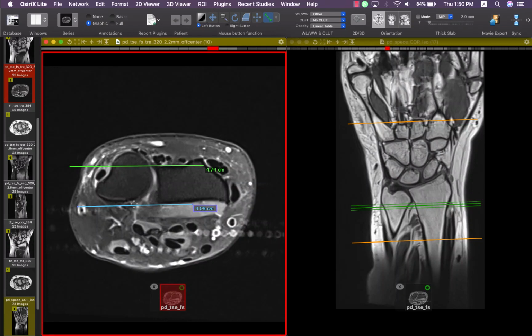If it is supinated, this rule is not applied. So you can apply this rule and say there is a dorsal or ventral subluxation of the ulnar head only if the wrist is imaged in a prone position.